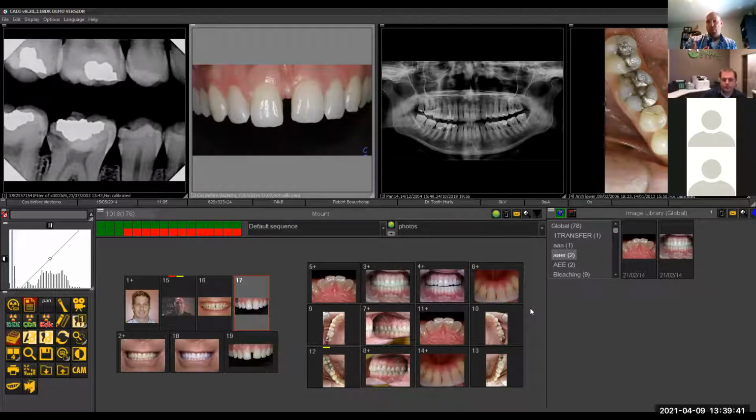So what happens is, on that station, as soon as you import and you go to point wherever you're going to point, that's the last place that it points is what it's going to remember. So if you do each station like that, unless they import and do something else where they're importing it elsewhere, then the software will always go back to the original pointing spot.